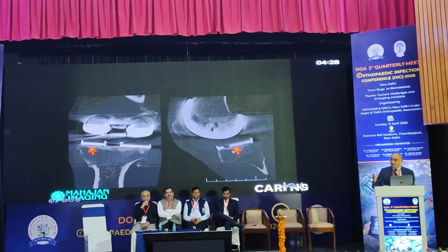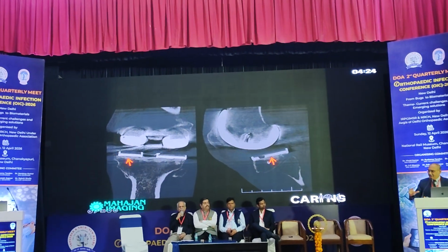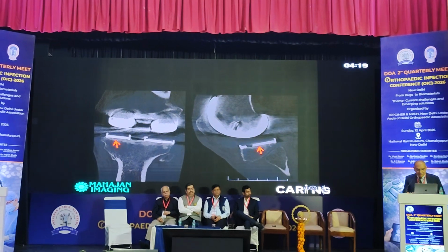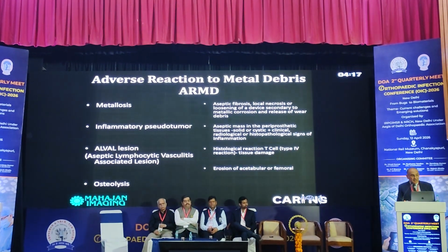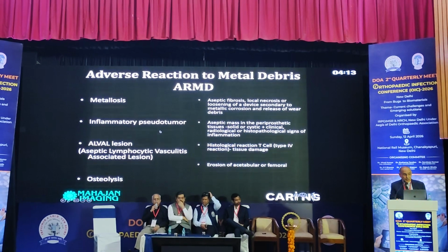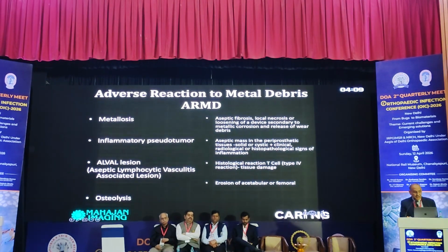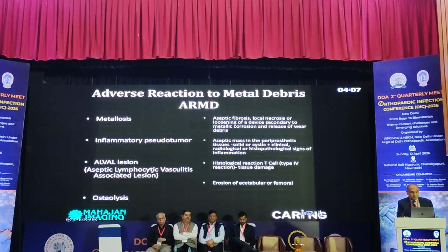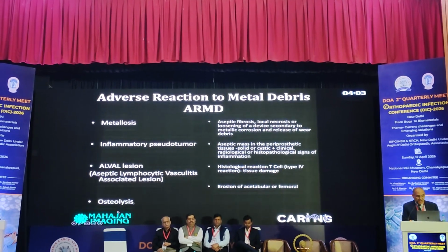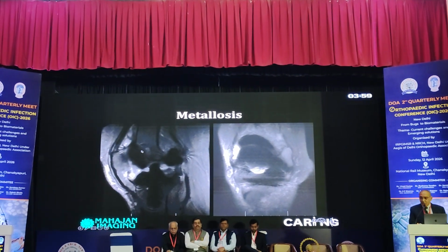Even on CT, if we have a dual energy CT, then the artifact that you get from metal on a CT scan can also be massively suppressed. Then we have ARMD, which is where you may have metallosis, inflammatory pseudotumor, the ALVAL lesion, aseptic lymphocytic vasculitis associated lesion, and of course osteolysis. This is a case of metallosis.